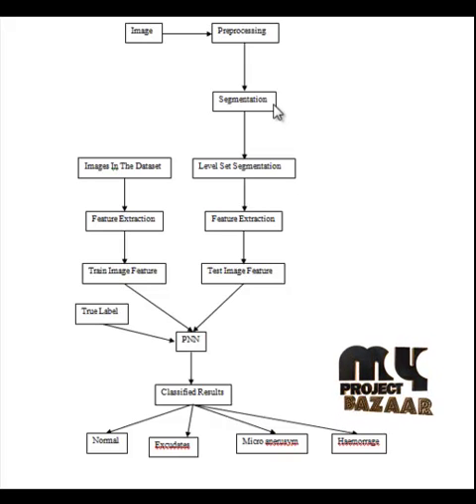Normalization of the images involves adding the average value of the three color channels to each color channel. This results in an increase in the contrast of the retinal image, which clearly identifies the reflected or brighter pixels in the image. Finally, the color channels are combined so that the images can be used for further processing.